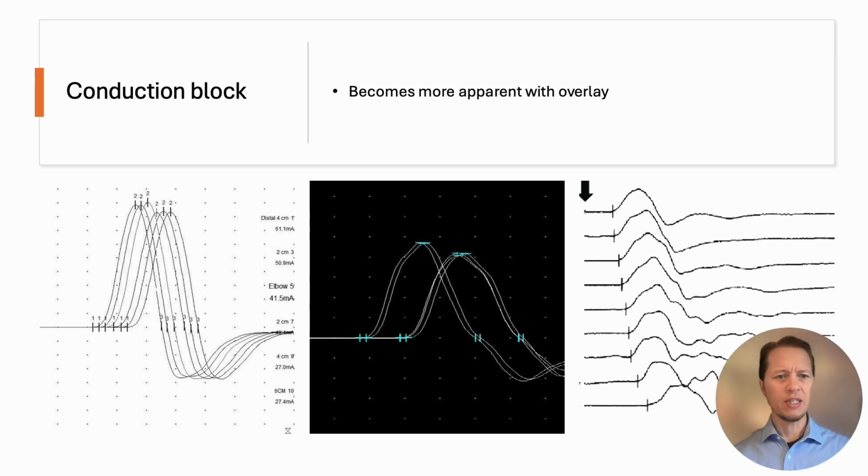might not think that's a big deal, but when the pattern emerges, this clearly looks like a case of conduction block. Sometimes the quality of the CMAP waveform just gets progressively worse and worse as you go proximally. That's another one, but here the amplitude looks like it's clearly dropping. So there is some subjective appreciation or assessment of the waveform as well in ulnar neuropathy.